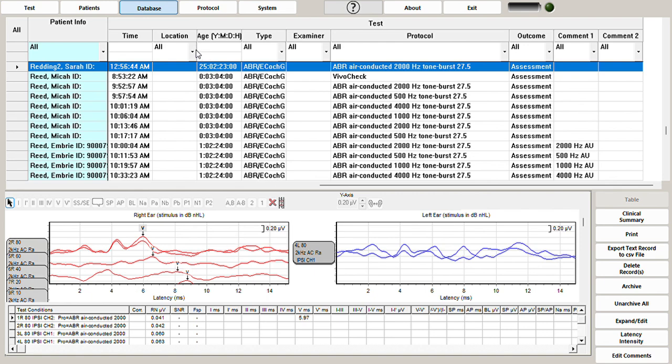We're going to go down to 10, put your statistical start and end. We can see that at 0.49, so still not great, but relatively high. You'll see these become much, much lower as we go. And then let's place one here as well. So statistical start and end. This one's at 0.30. So to know that you've got truly a wave 5 that's present, we want to look at this and make sure it's greater than 0.60, but you also want to make sure things replicate. And so again, that's why you want to run 2 waveforms.